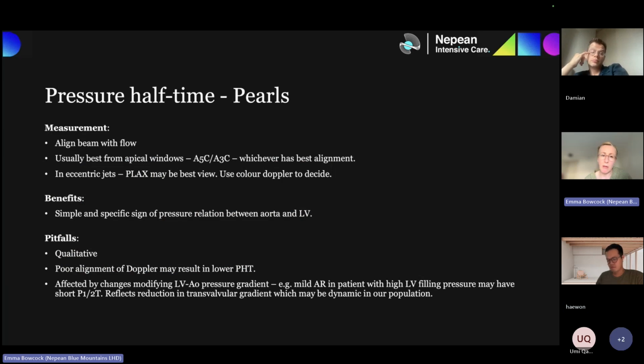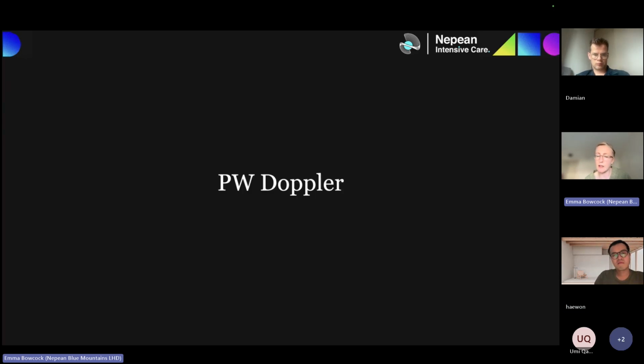So I think we've spoken about most of these sort of pitfalls and tips for doing pressure half time. For us in intensive care, being mindful of this bottom one, the things that I've just spoken about, is very important, especially when you're just starting off. When you are just starting, we do tend to want a bit more quantification, like with numbers and things. We can fixate a little bit on numbers. So it's just really important to be aware of the caveats of pressure half time, as well as the good things about it too. Pulse wave Doppler.